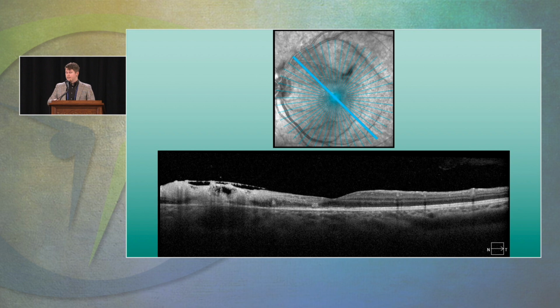So if we look at this, she's got a full thickness retinitis. You can see that on the left side of this OCT image. There's some inflammation. You can actually see the white blood cells depositing along that posterior vitreous, just overlying that full thickness retina. And then you can get a hint that the choroid's not at least significantly involved. It maybe is a little bit elevated there, but you've got a lot of shadowing, hard to tell for sure.